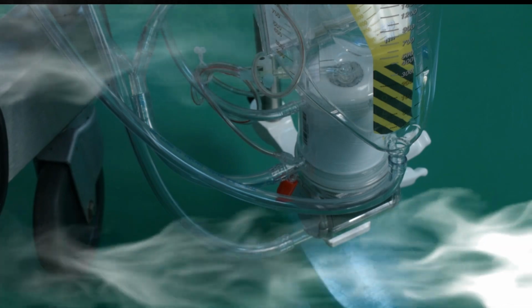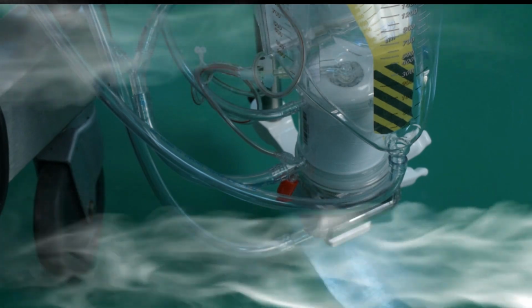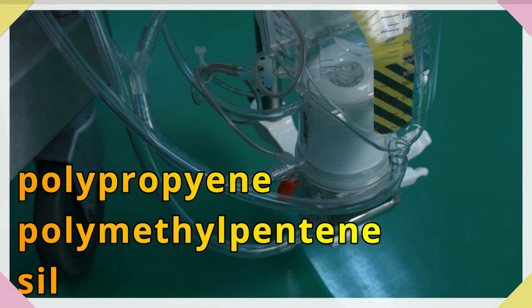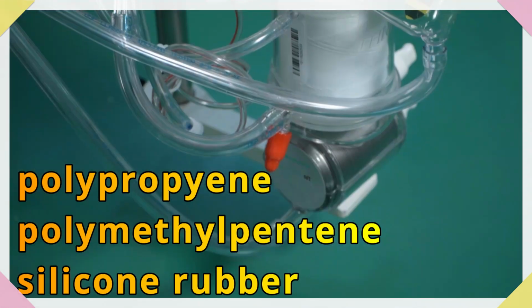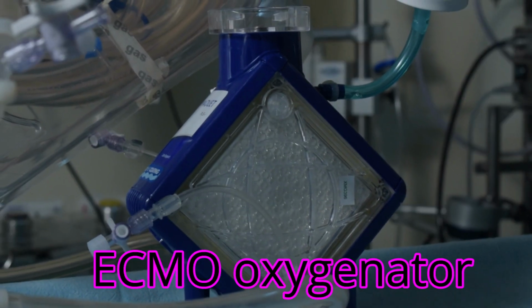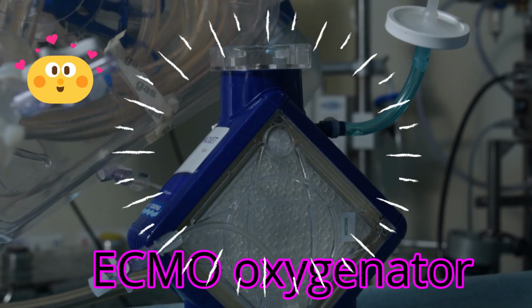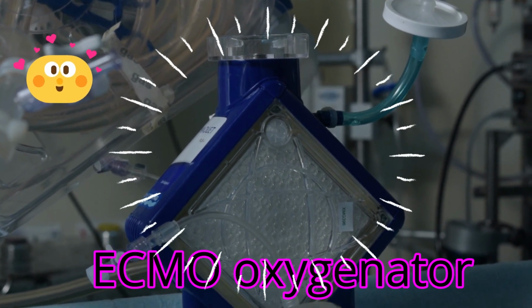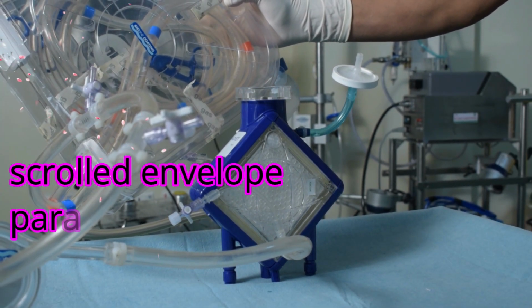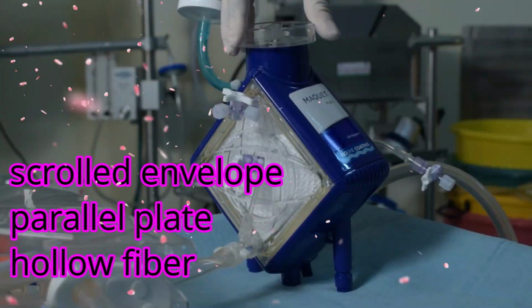The membrane oxygenators imitate the lung by having a thin membrane that could either be made of polypropylene or silicone rubber or polymethyl pentene, may have pores or may not have pores, may be a true membrane, and may be configured in various types like the scrolled envelope pattern, parallel plate pattern or the hollow fiber type.